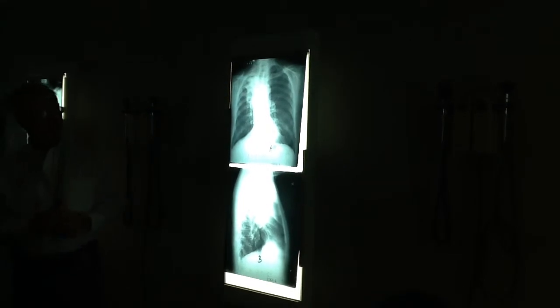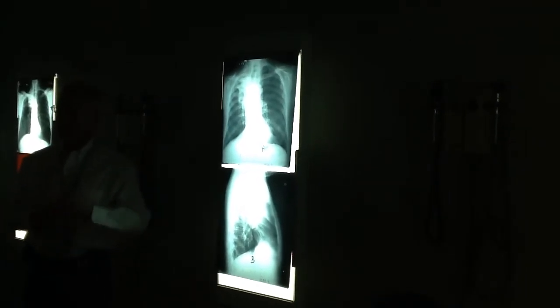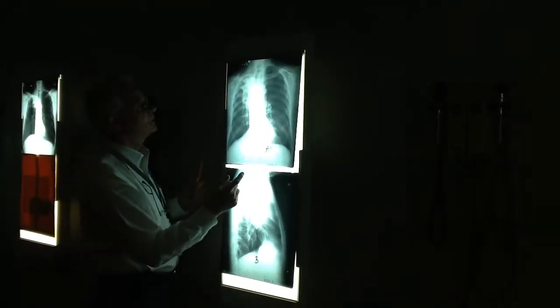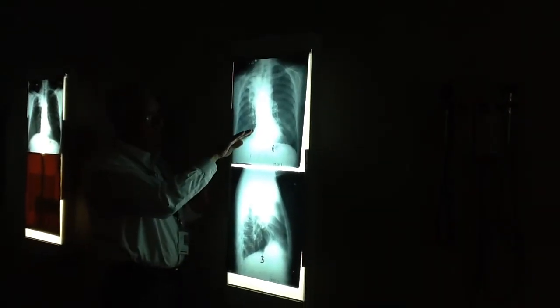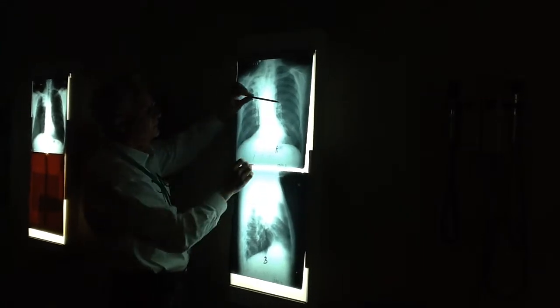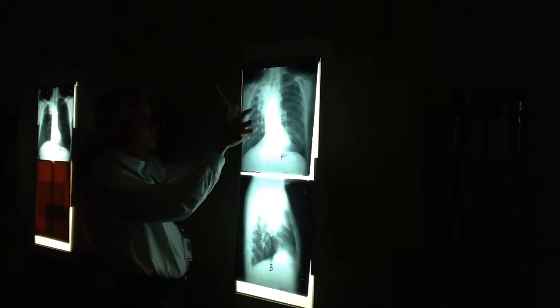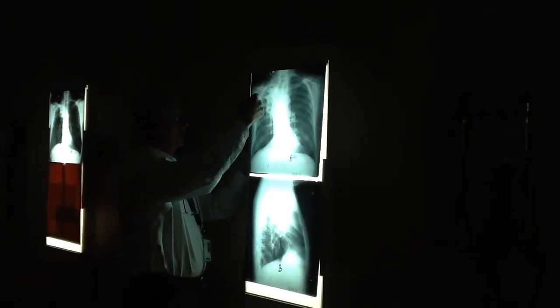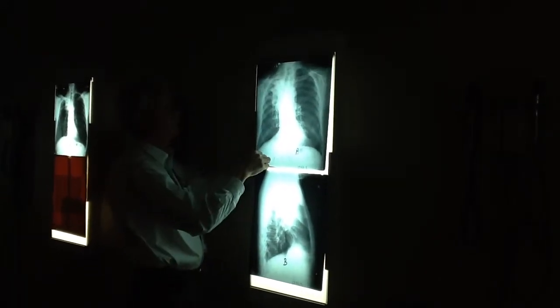And the answer here is obviously, yep. And toward or away? Toward. Toward, exactly. So what things are moving toward? You mentioned some of them. Trachea. Very obvious, trachea. Maybe a little bit of the diaphragm. Hilus. Yeah. Oh yeah, definitely hilus. And look at how straight the lower blood vessels are. It's like you just reached in with your hand and grabbed the hilus and pulled the thing straight up. It's going to take those vessels from this to this. It's going to make them very vertical.